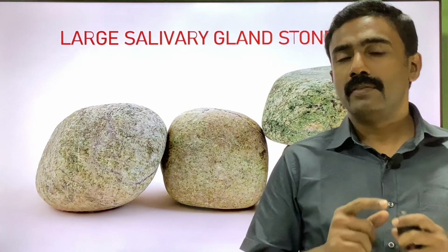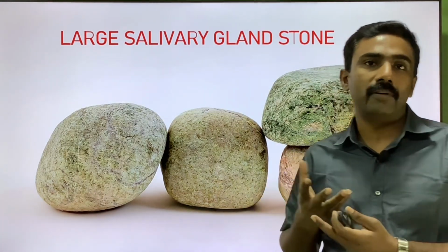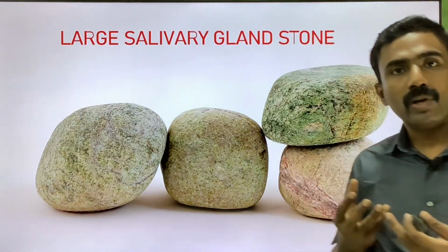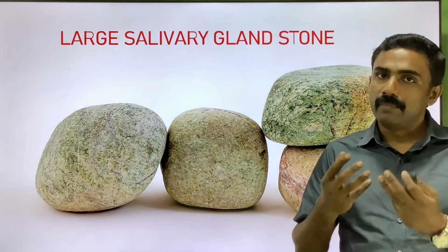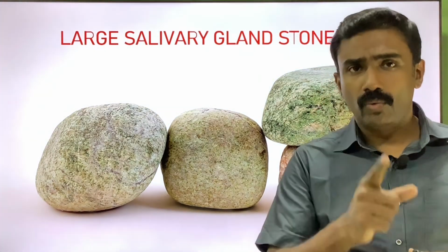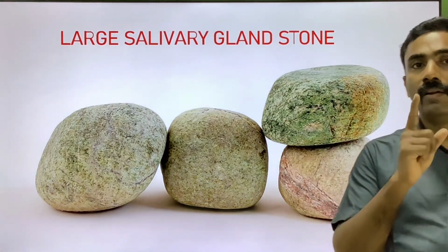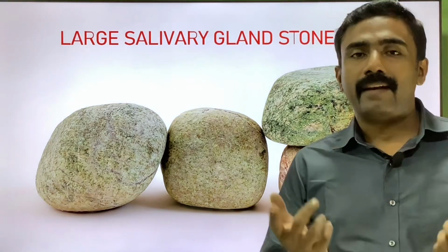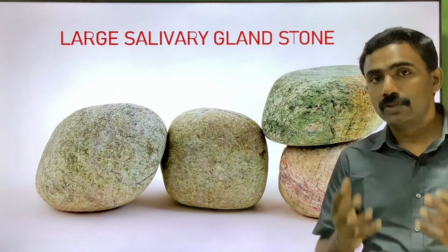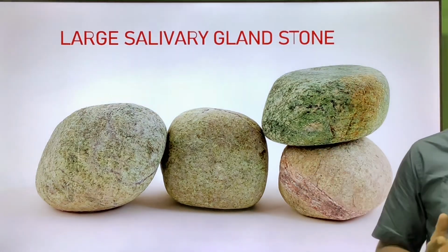An orthopantomogram helps us rule out dental causes, which may also mimic a submandibular gland swelling, because any space infection from the mandibular molar teeth can mimic submandibular gland infection. So first, rule out dental issues with the help of an orthopantomogram, and the OPG can also give some information regarding large stones.